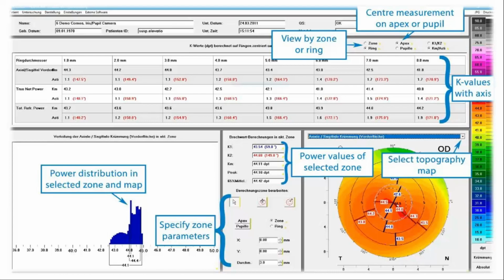So here in post-refractive surgery, especially in post-RK patients, we do see a blue bar which is widely distributed from lowest range to highest range. The spread is more in post-RK patients when compared to normal regular corneas or post-LASIK patients.